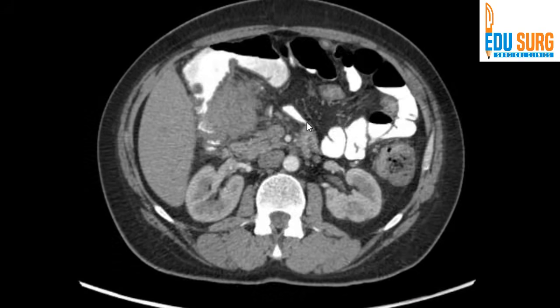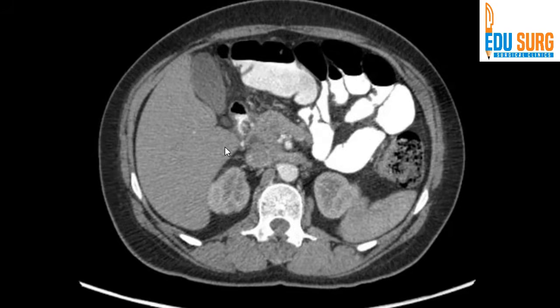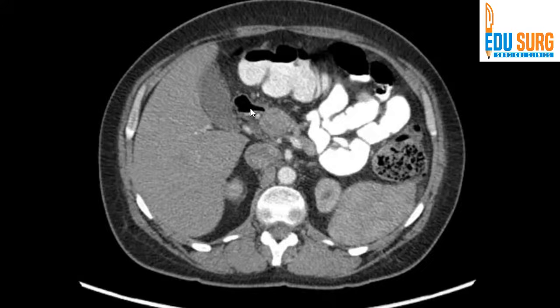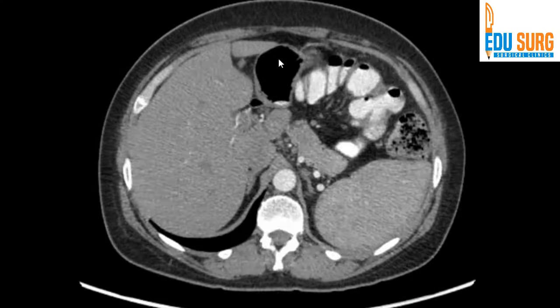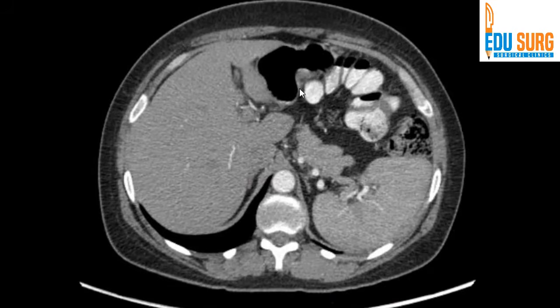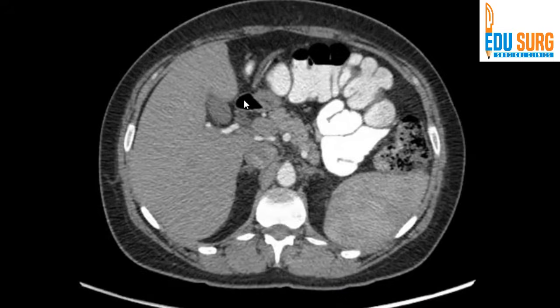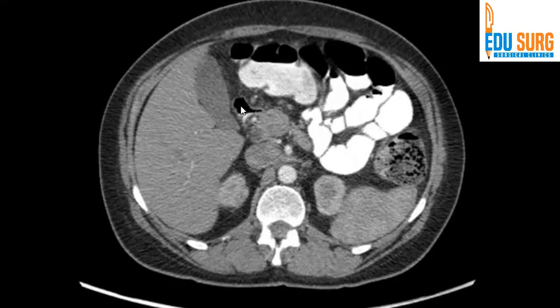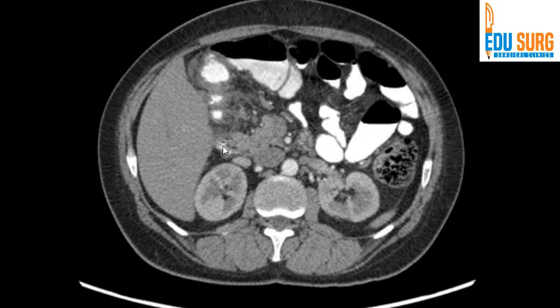Origin of the tumor, if you have a doubt, you can see thickening around the colon. This is the duodenum, and you can see that the duodenum is more or less free. There, it has opened into the stomach. That's the stomach. So trace stomach, take it down, go down towards the duodenum. That's the duodenum. That's the duodenum, no tumor.